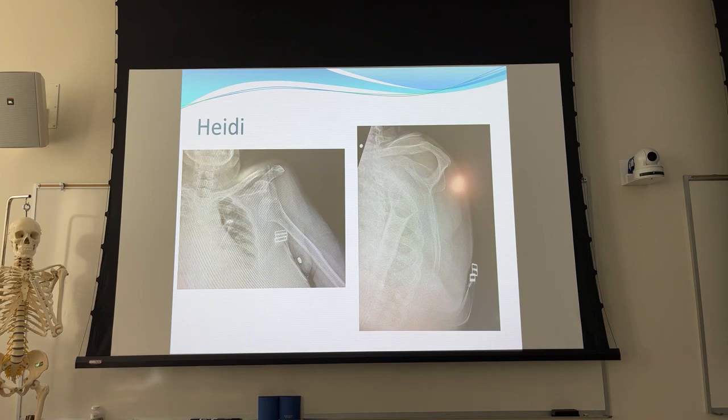That's impressive. So we've definitely got dislocation, and you can't really tell if this is a fracture line or a skin fold or what exactly. It wasn't very big, so it probably didn't have just wrinkles like that.